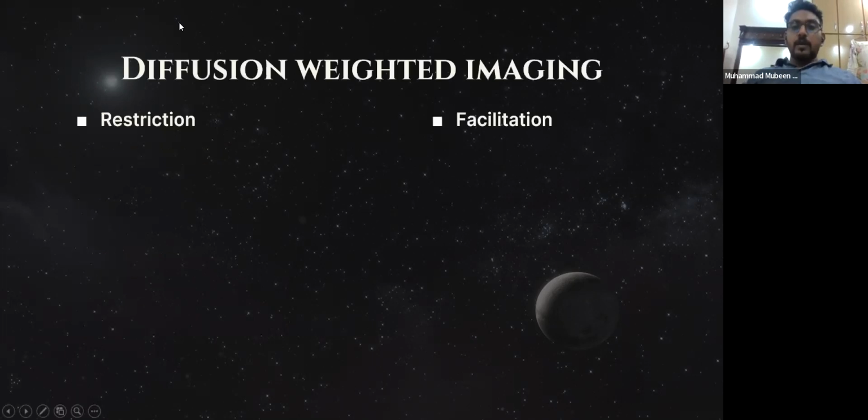Next, a really important imaging is the diffusion weighted imaging. It's a very sensitive imaging, but with very poor anatomic detail. It's widely used, it's really easy to get, and in many centers it's a part of the stroke protocol because it takes really less time to obtain compared with the other sequences of MRI. We know that it takes 15 to 30 minutes to completely do an MRI of the brain, to clean out all the sequences.